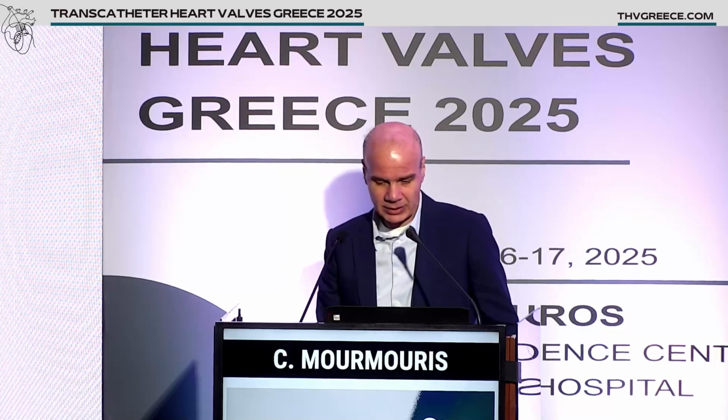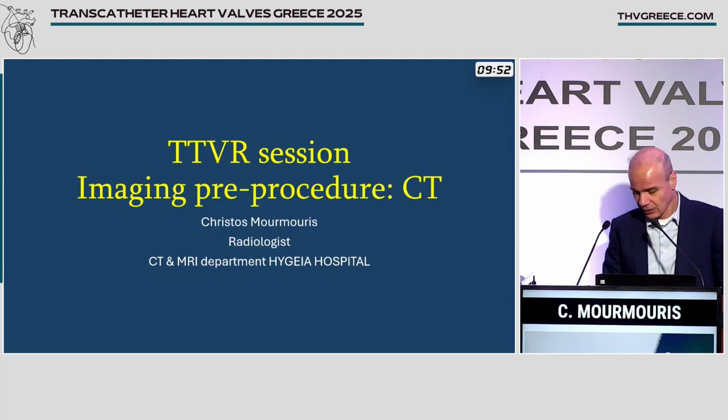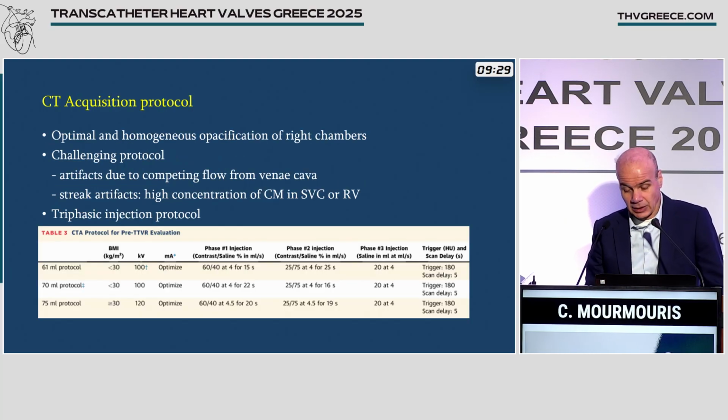Good morning, everyone. For the next 10 minutes, I'm going to present the role of CT in the evaluation of patients before this procedure. Now, CT plays a major role in pre-procedural planning. Due to high isotropic spatial resolution, it can provide 3D morphologic information on the tricuspid valve and adjacent structures, and also provide accurate and reproducible measurements.